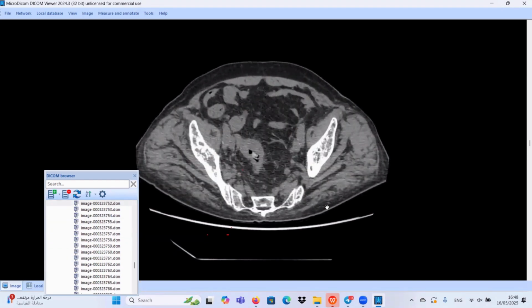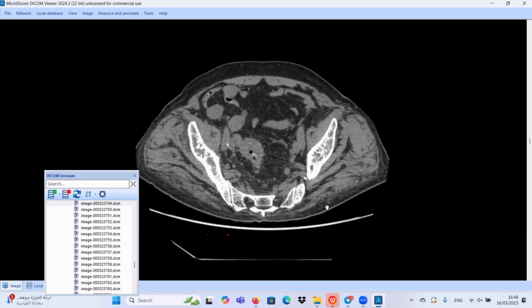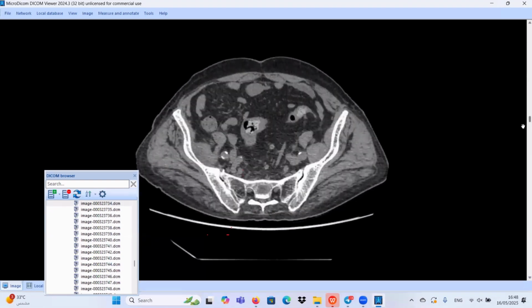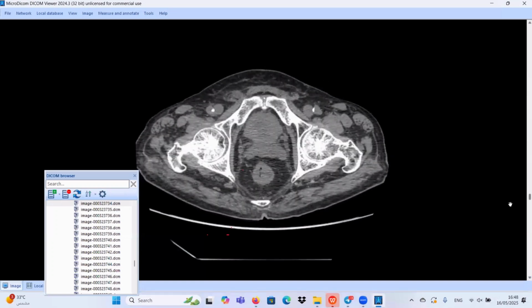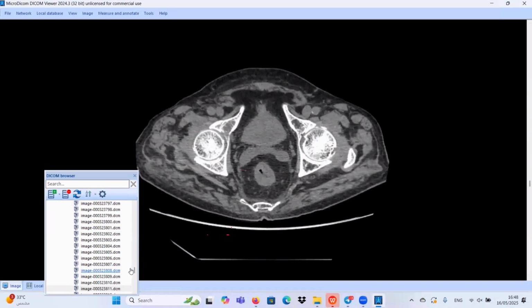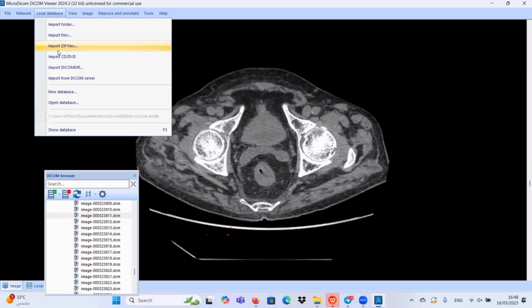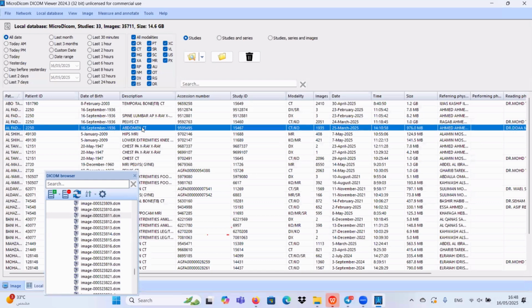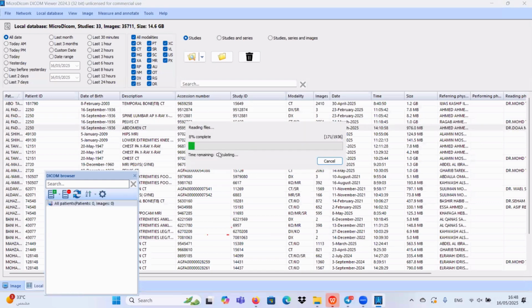So in my routine practice, as you said, we will search with MRI for any lymph node, for any primary tumor. We recommended for this case CT abdomen and pelvis and chest with oral and IV contrast. Let's see what we will find.